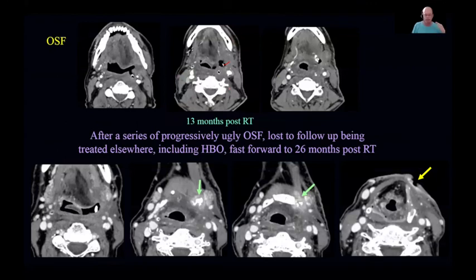This is all a fragmented hyoid, which ultimately drained into a submental or anterior cervical fistula. So these cases can sometimes become complex sagas.